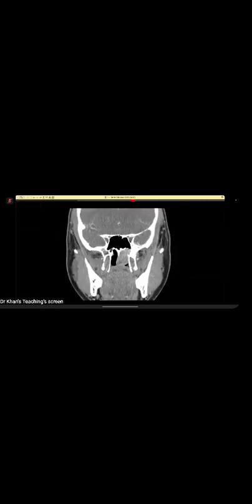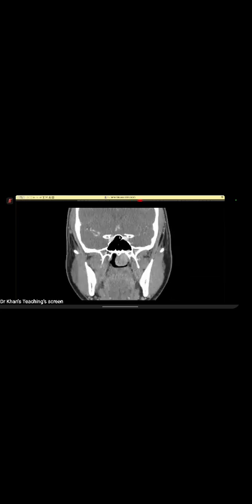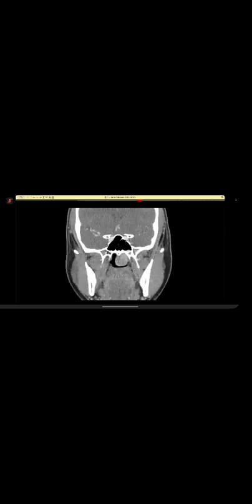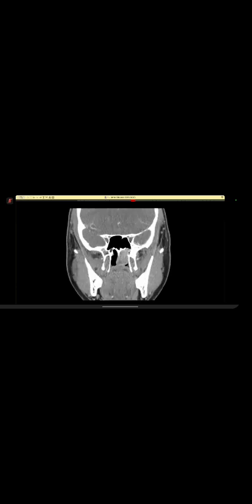Other than the diagnosis, the fine touch was this, and this is the pterygopalatine fossa. The candidate did well. We asked for contrast, and even here the same finding is visible, and you can see this enhancement which goes in.